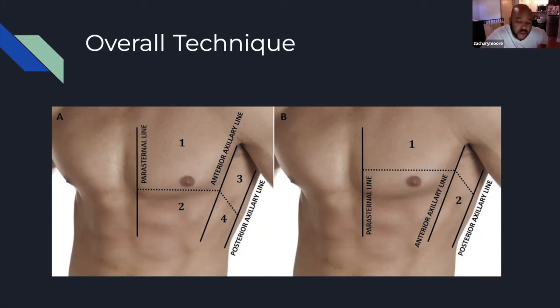But if you do see those things, note how many there are and whether they're confluent, and you also have to take into consideration the clinical picture. Is it acute? Is it chronic? Does it represent fluid, fibrosis? The horizontal artifacts would be more like A-lines. And you have to see if those A-lines are interrupted by B-lines or so forth.